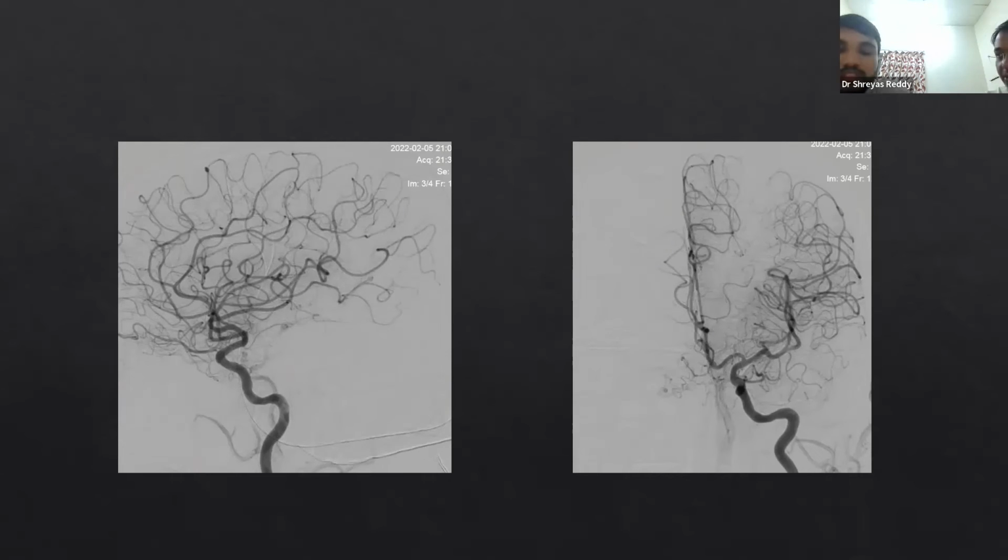You see the ICA is totally occluded, but the infarcts are small in that area, right? What is the meaning of that? That means the brain has very good collateral status. Can you name one other imaging modality that can confirm this collateral status? Triple phase CT of the brain. Triple phase CT has three phases of angiogram, which confirms in what phase the collaterals are seen. Based on that, we can tell whether the patient needs a thrombectomy or doesn't. How long can we delay the thrombectomy? Fine, we'll not go into the details of that imaging modality. We have done the same thing here. Can you go to the next image?